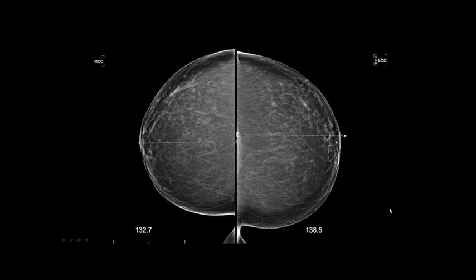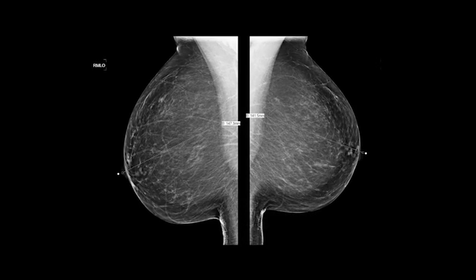So they will mark you off on your paper on that. You're going to get marks, you're not going to have the perfect image. You will get some kind of marks, but when you start getting 4, 5, and 6 marks, they're going to give you a deficiency letter, and they're going to want you to redo it. So you try and do the very best with the least minimal.